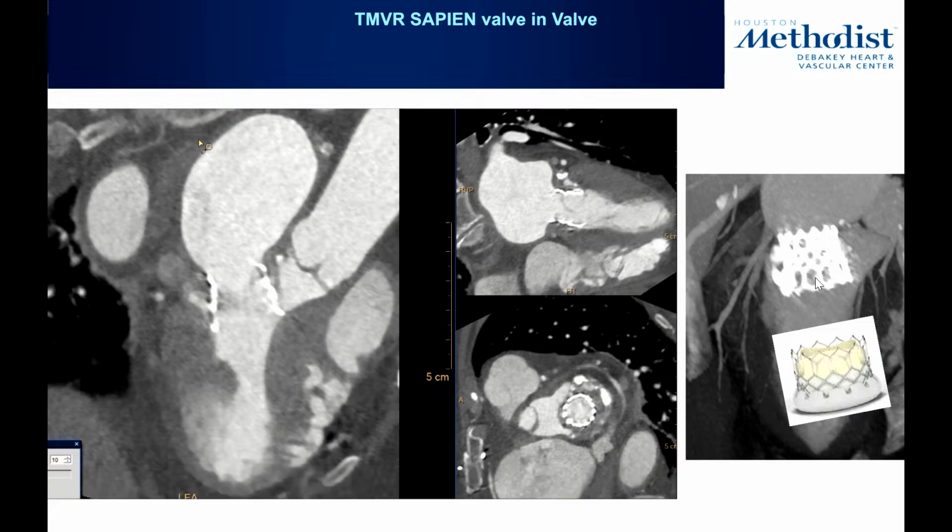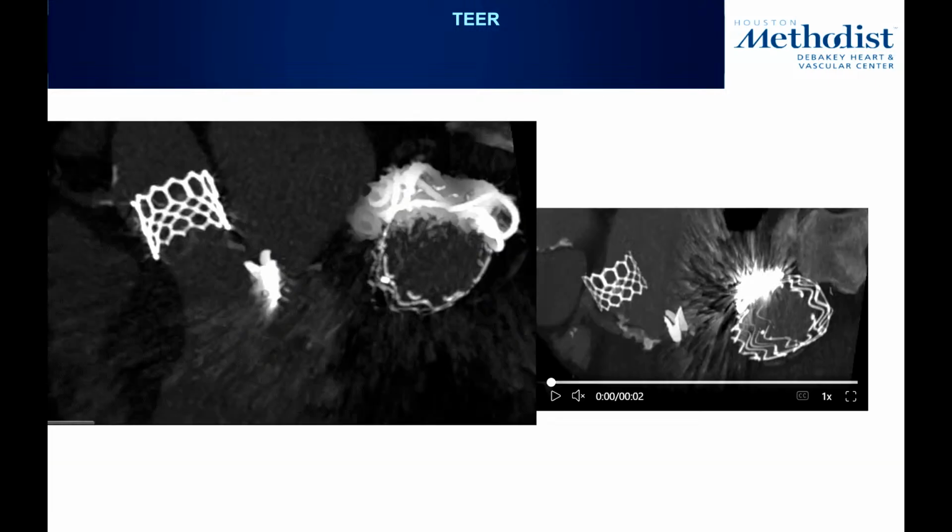And with this thickening, with MPR, you can see the whole slab, and somewhere there's enough room for the blood to go through, and there's no physiological consequence of this apparent pseudo-LVOT obstruction. There's obstruction, but not significant. And obviously, the answer is the echo Doppler. There's no significant gradient. Okay, so this is just a rendition of it.